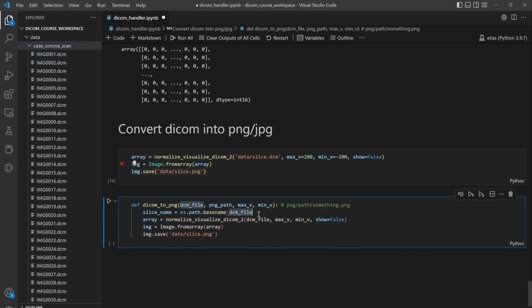We can do that, but since we need only the name, we don't need the extension. So we need to split. There are two ways we can split, but that takes another line to do the split, and it's a waste of time. So we can just take everything minus 4. Why am I taking everything minus 4?